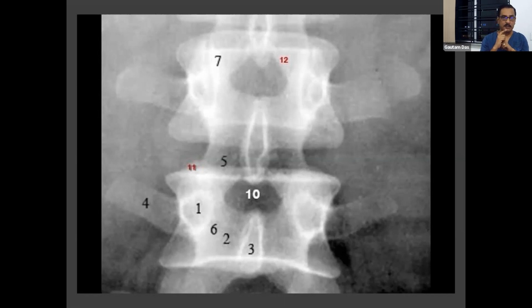Like an artery, in the pulmonary artery, many times you see that the artery is a long structure if the beam is falling longitudinally. But if it comes in line with the artery, it shows as a circle. Same here. It is rounded because the beam is coming perpendicularly over it. But if the beam is coming laterally like this, then you can see the pedicle as a pillar.